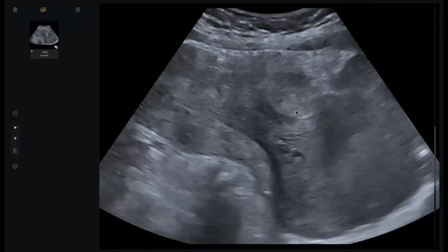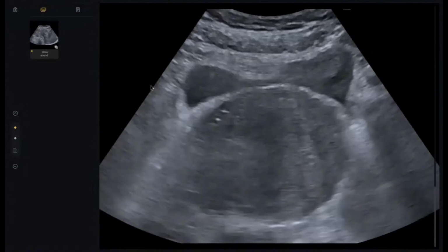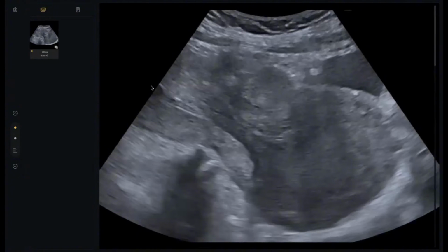Yes, sir. Doctor, this patient has severe pelvic pain. Request control. Sir, sorry, I'm unable to scroll. Can you please scroll for me? Sir, is the patient male or female? Female. Female patient with the pelvic pain.